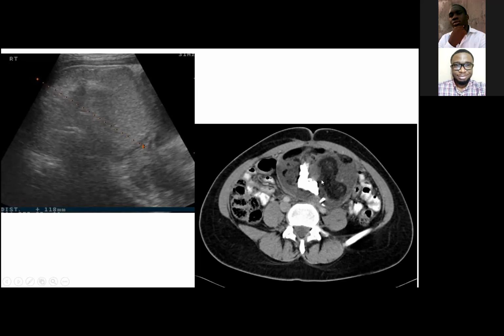Whilst normally in young patients with abdominal pain, this is actually a case where we got the correct diagnosis from the outset using abdominal X-ray, although the abdominal X-ray was not the right test to perform initially. The right test to perform in this history would have been an abdominal ultrasound and then a CT scan. There was no role for an X-ray of the abdomen in this case, but as it happens, sometimes where you have certain masses which have characteristic appearances such as dermoids, abdominal X-rays can be useful, but I wouldn't have done that as a first test.